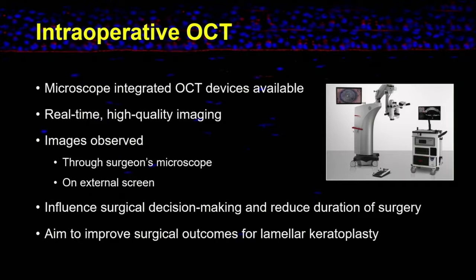When we move to intraoperatively, there are 3 microscope integrated OCT devices currently available, and this provides real-time OCT imaging of the anterior segment. These images can be observed through the surgeon's microscope using a heads-up display or also on an external screen. And the aim of intraoperative OCT was to influence surgical decision-making and also reduce the duration of the surgery.